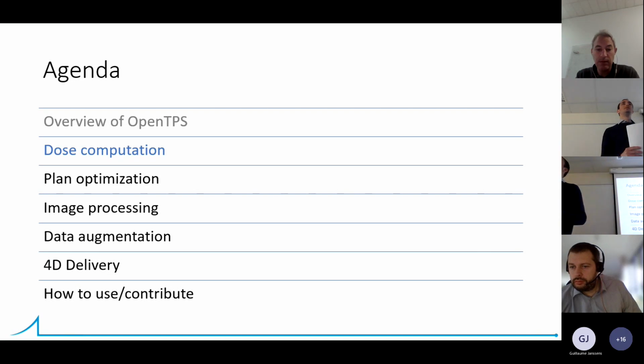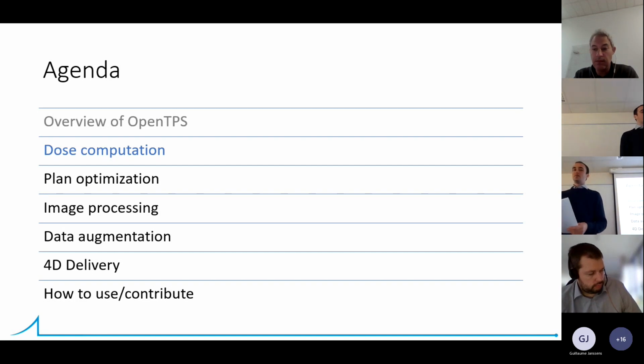We have one related to the exercise that you've just shown. So you said first, for example, we can create a synthetic CT and then an RTPlan, and then use the GUI to make the optimization. The first part is synthetic CT creation, for example. Can you do that from the GUI as well, or is this typically from the core? Okay, so the question is, can we use the core library in the GUI to create, for example, synthetic data or to launch computations from the GUI? I believe that's the question.